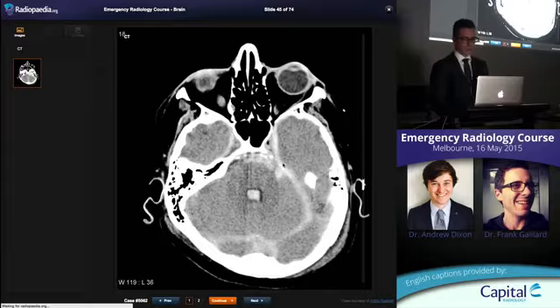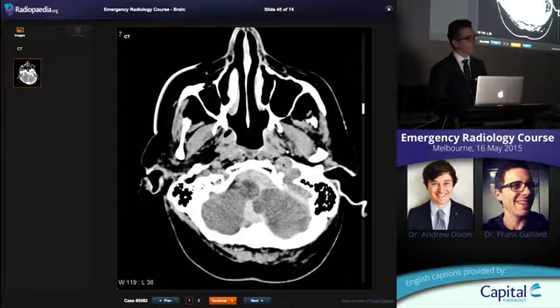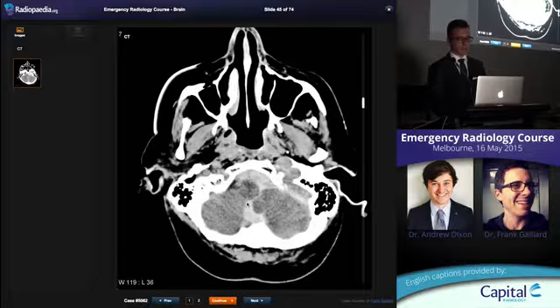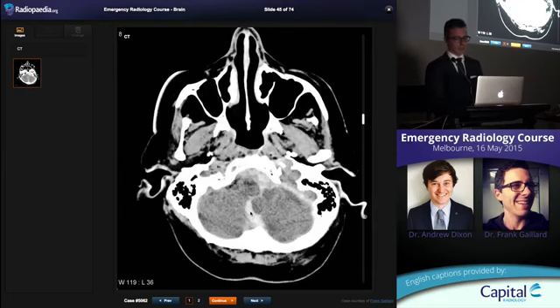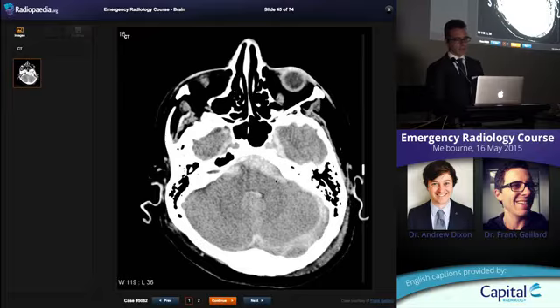Another cause of subarachnoid hemorrhage, which is, believe it or not, even worse than aneurysms, tends to occur in the posterior fossa. And here we can see vast quantities of subarachnoid blood surrounding the upper cervical cord and medulla, extending into the foramen of Magendie at the back and Luschka on either side, filling the prepontine cistern.